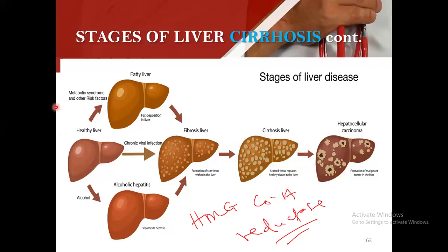At the cirrhosis stage, the liver will shrink. When you measure, you get about 10 to 11 cm in an adult, and you see a pool of fluid outlining the liver. When it gets to hepatocellular carcinoma, the liver can enlarge again.